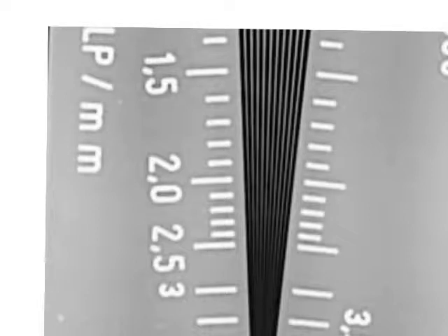And so with these lines now, what I'm looking at is these lines are actually white and black. That's all that there is, white and black. But when I'm looking at this picture, it actually looks like there's some grayness there. I don't actually see a white line, I see a gray line, right? So contrast resolution is looking at the point.